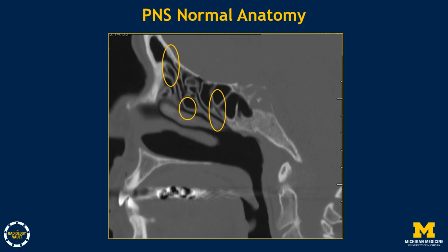To summarize, the essential underlying principle of approach to studying the paranasal sinus imaging anatomy is to recognize the three inherent narrowings of passages which drain the paranasal sinuses. The first is the frontal recess, which drains the frontal sinus into the narrow anterior portion of the hiatus semilunaris.